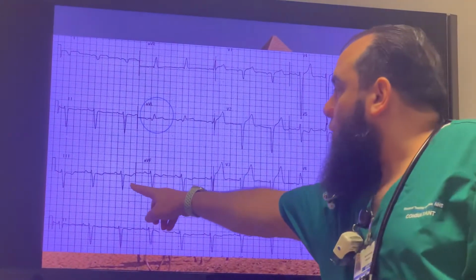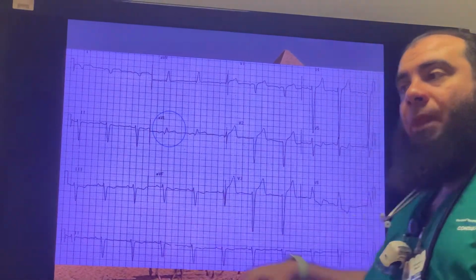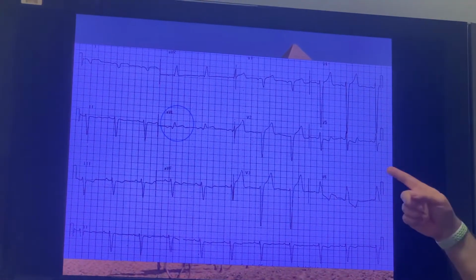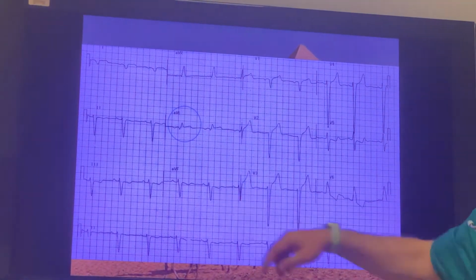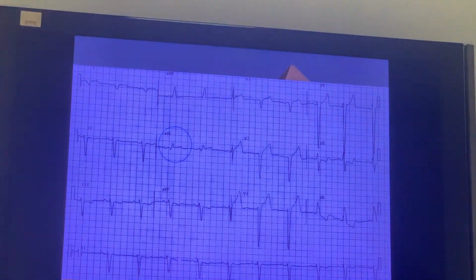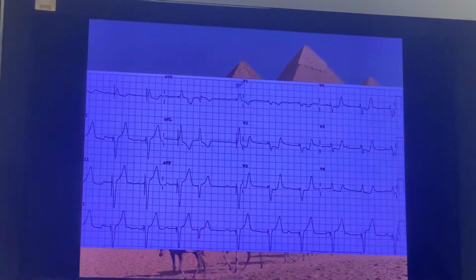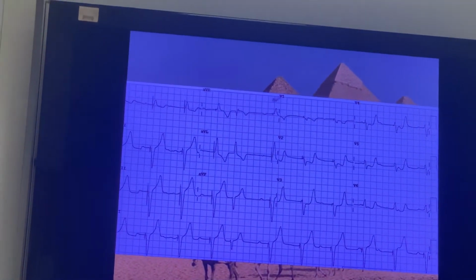In lead III with a negative complex, I expect a positive ST and positive T wave, and it is not there if you have the same. Is it okay? Another one. Is more clear. What's that?